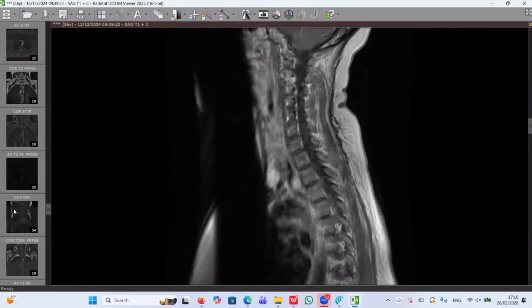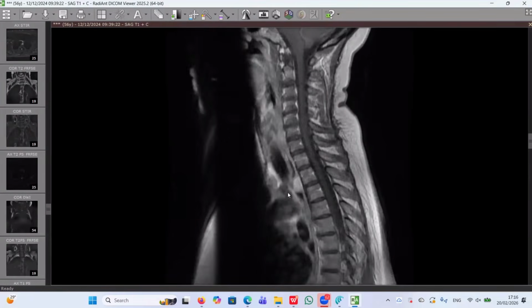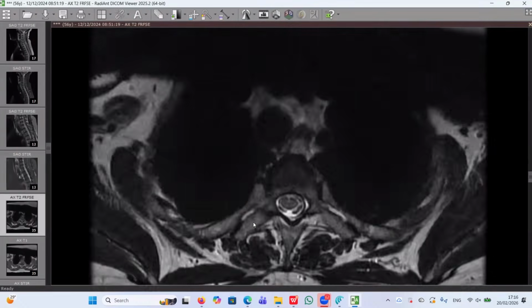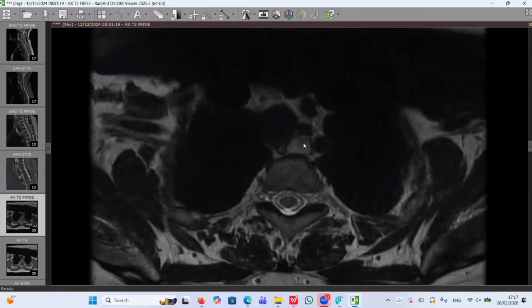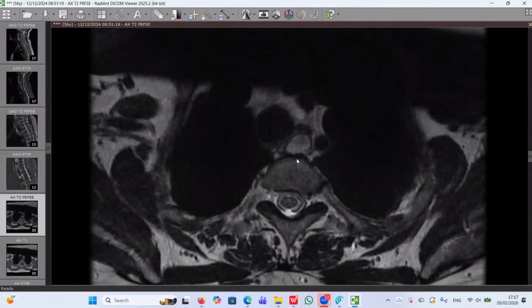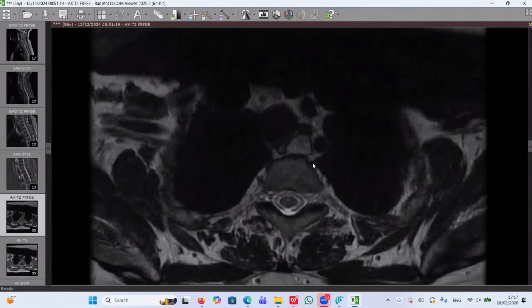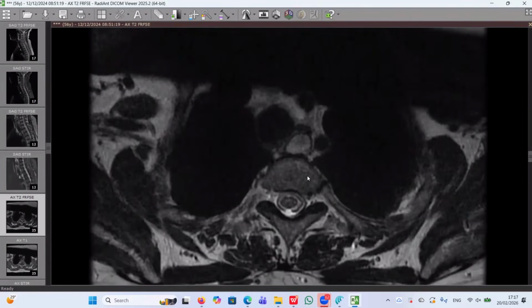Okay, agree. I think it is located in the prevertebral region. Okay, retroesophageal in location. It is mostly indenting and displacing the esophagus anteriorly. It doesn't erode or destruct the vertebral body posteriorly. Yes, it seems a benign structure. Yeah, it's smooth in outline, capsulated. Really, we have been following this case for more than 5 years, and it is stationary.